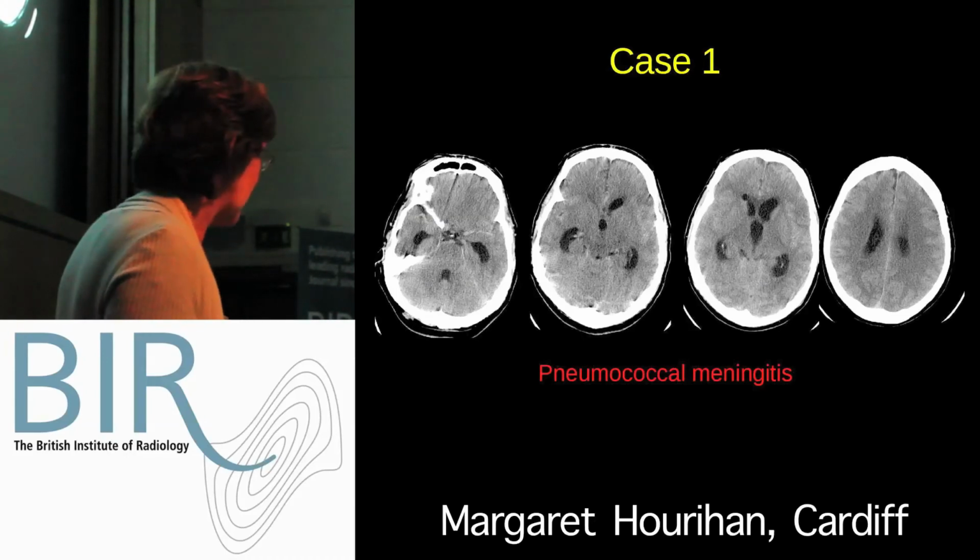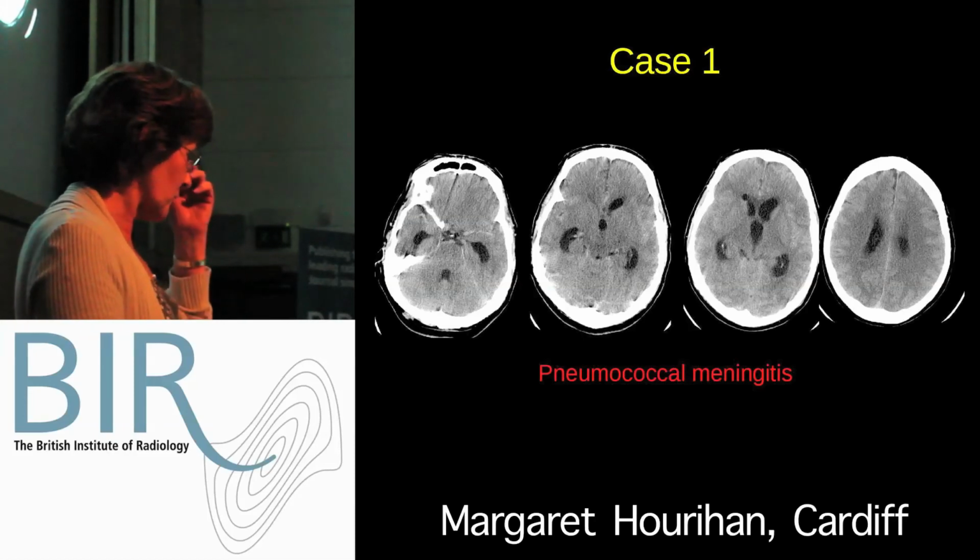Okay, so let's look at our cases finally. Any ideas what's going on here?